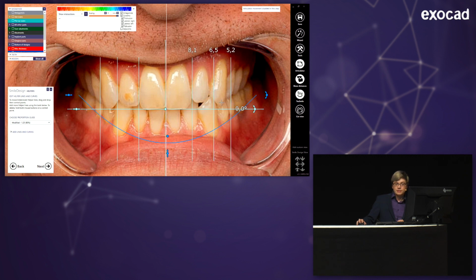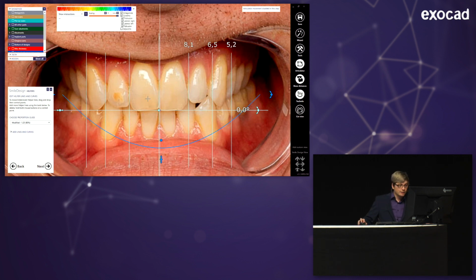And you already see, because again, maybe the picture was tilted or the jaw itself is tilted, it's hard to say from a picture, that the ratio isn't the same on both sides. And this is one of those cases where smile design really comes in handy, because then you have a possibility to redesign a bridge in an aesthetic way which matches the patient. You would never design a bridge like that, as you might see in the next steps, if you didn't use the smile design. I can also place a laugh line here.